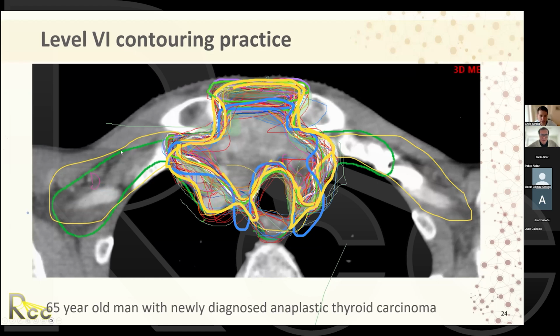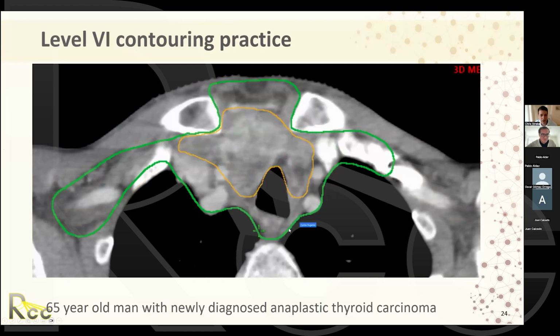Don't worry too much about this. The patient had a lot of neck lymph nodes on the right and left, so that's why we're going over here to level 5, which I didn't tell you about. But what we're really looking at is this central region. This is what my contours look like. You can see they go back here, and then I swing down and include the whole esophagus.